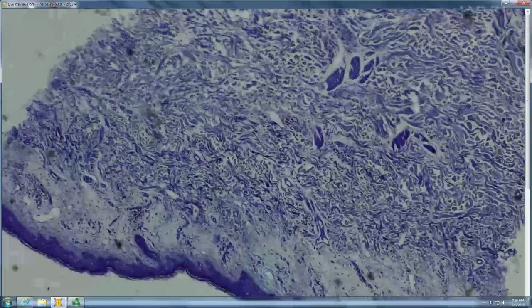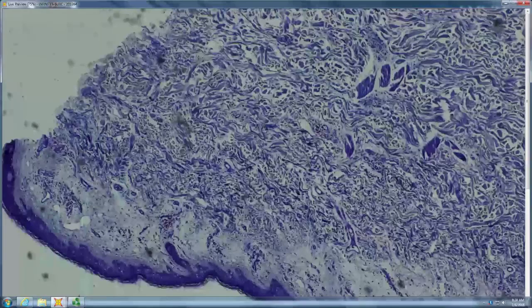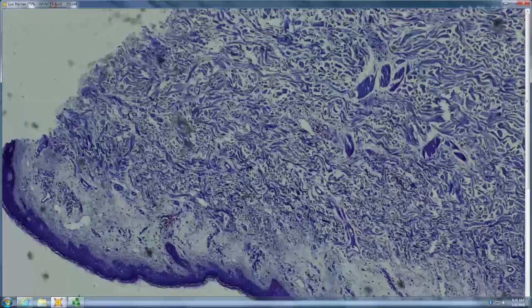The history is that this is leprosy. My guess is this is a reactional state with the limbs, and I don't see a lot of granuloma. This is probably not a very high yield area. Remember, if you're looking for the organisms, especially in tuberculoid disease, you have a higher yield with PCR, but in order for PCR to work, it has to be in alcohol, not formalin. So if you're thinking PCR for an organism, alcohol, not formalin.